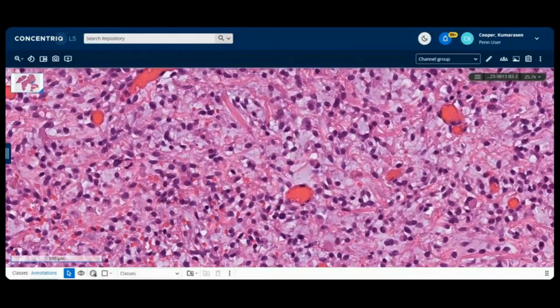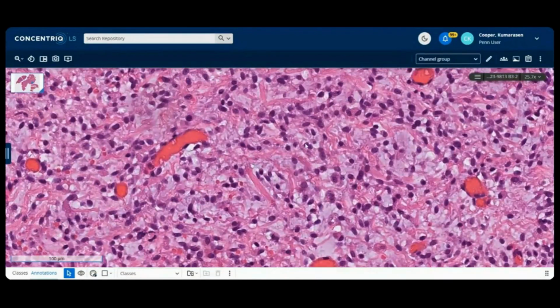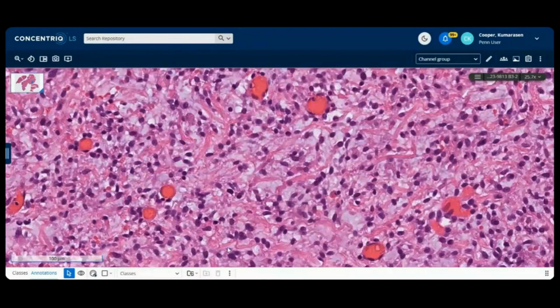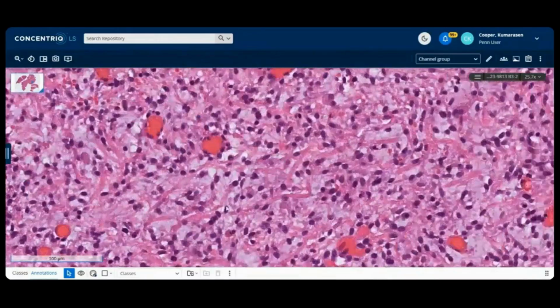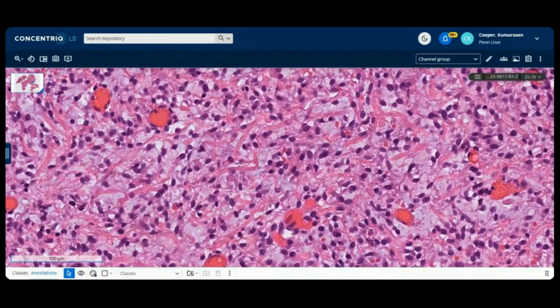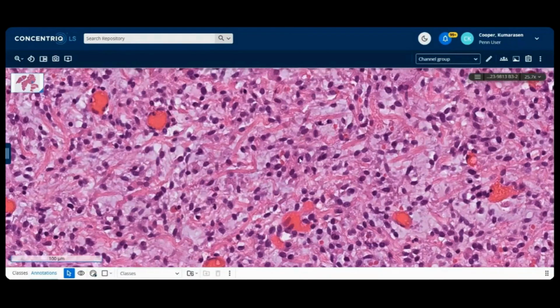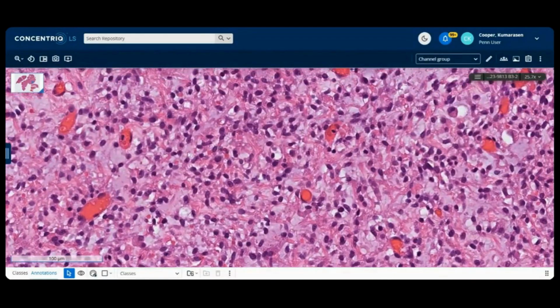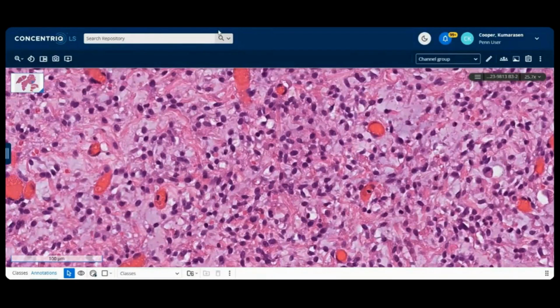All right. So collagen, wiry, little small bands. Don't take my description. I don't like uttering descriptions which put you on a wrong pathway, but some of them do remind me of certain morphologies. So as I see it, it's not quite rope-like, but there's some collagen there as well. And here it's looking a little more spindled. Let's see if anybody's coming up with any thoughts so far.